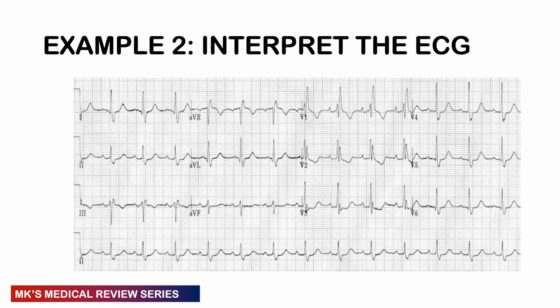Moving on to the next one, interpret the ECG. Like I said, practice, practice, practice. Pause the video, take down some notes, make your diagnosis. What are the abnormal findings on this ECG? And here comes the answer.